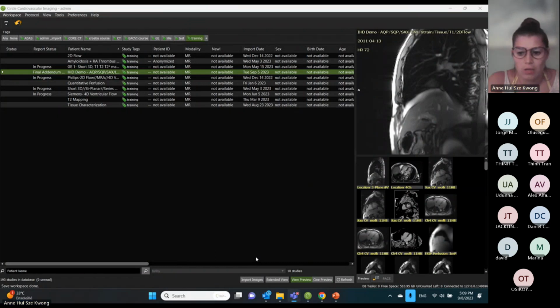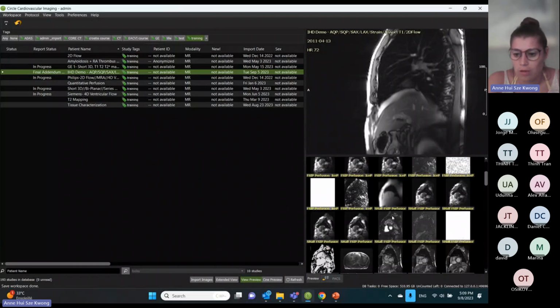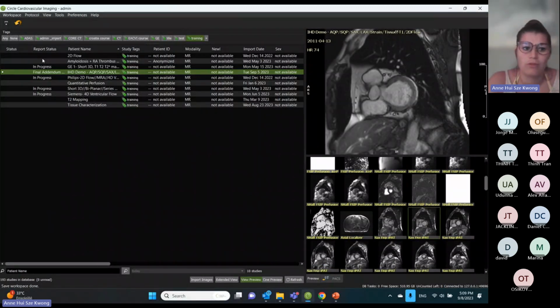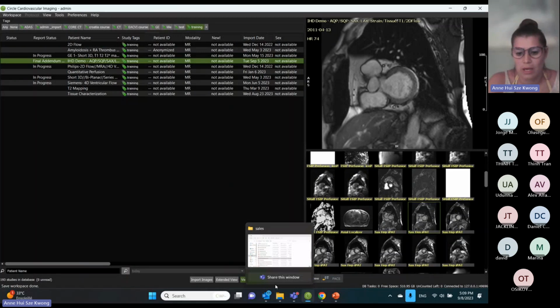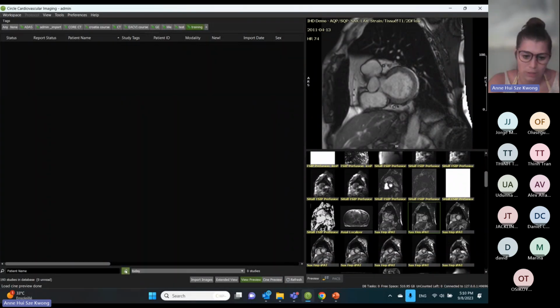You can see all the different series of images on the top here, and you can click on all of them in order to visualize. So this is a pre-visualization even before opening it, in case you want to have a quick look. You can also activate the Cine preview if needed. Everything in green in the software is activated, so it's quite useful to see if it's activated or not. You have a filter per name or per date as well here.